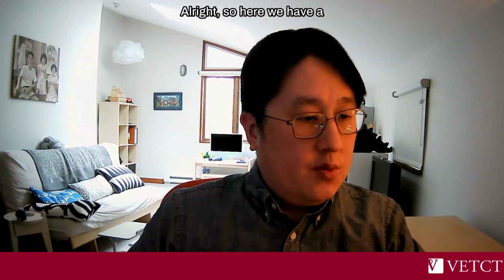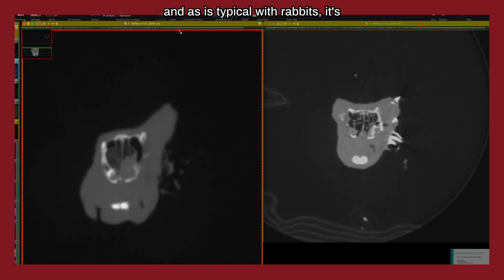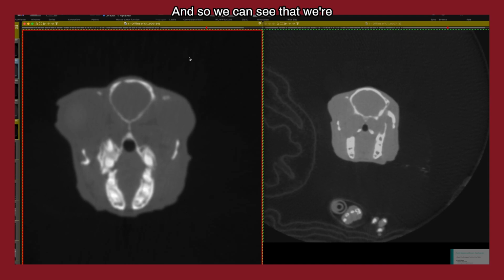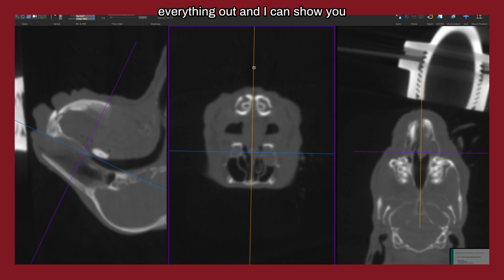All right, so here we have a cone beam CT of the head of our rabbit with chronic dacryocystitis. And as is typical with rabbits, it's hard to get them straight, so we can see that we're a little bit off center here. So what I'm going to do is bring up our multiplanar reconstruction tool so we can straighten everything out and I can show you exactly what's going on.